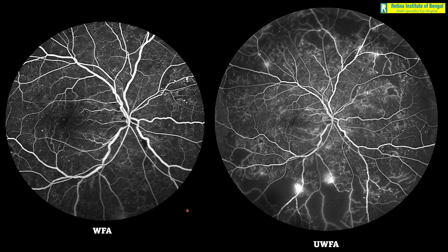In other words, in this particular patient of diabetic macular edema, once again we see that if we had depended just on multicolor imaging and OCT, or even done an OCT angiography, still we would not have been able to grade the diabetic retinopathy appropriately without this wide angle and ultra wide field angiography. So you can see these areas, these are the asterisks, the stars and these arrows obviously highlight the pathologies which I have already discussed.